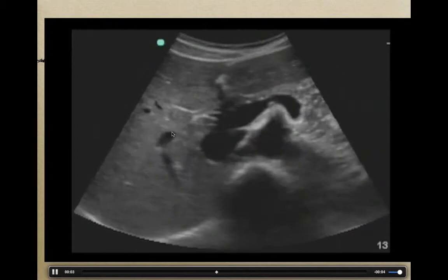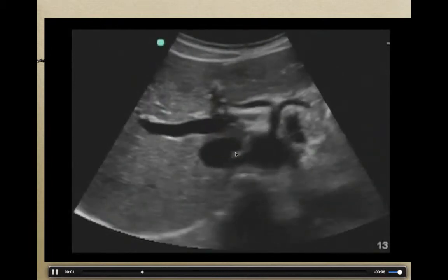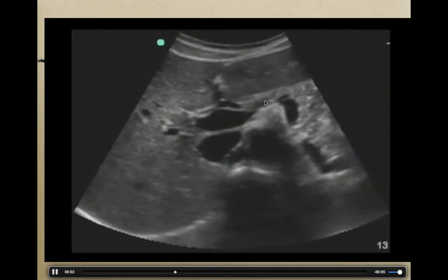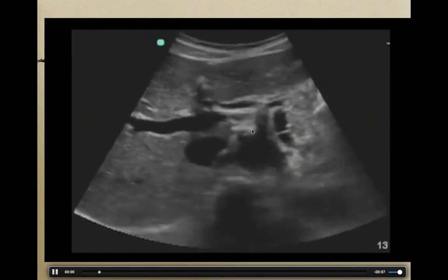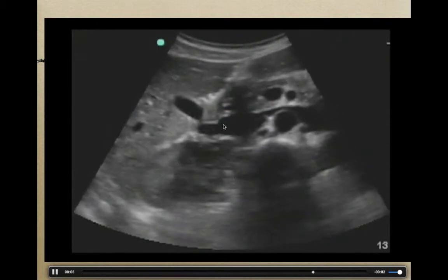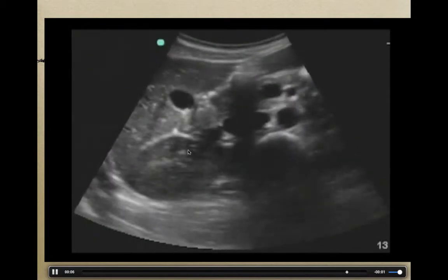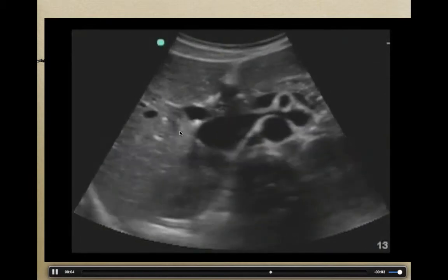Here, as a refresher, is the anatomy that we're going to be looking at. Here's the IVC here. Here's the aorta. There's the splenic vein coming into the portal circulation. We see the portal vein here. This is the celiac axis right over there. This is the SMA here. And you can see quickly how, again, portal vein here, all of these vascular structures can make things quite confusing, which is why reviewing your vascular anatomy and reviewing your liver anatomy when evaluating any tropical disease as it affects the liver is going to be pretty important.